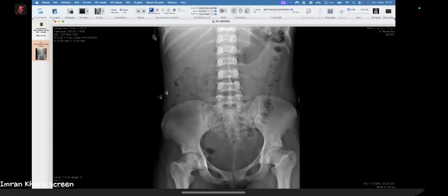And so in this kind of case, you've picked up the most important findings, right? You've picked up that there's H-shaped vertebrae, there's avascular necrosis. You've added 1 and 1 plus 2 together to give the diagnosis of sickle cell disease. You can give the relevant negatives in this case. What would be the relevant negatives, bearing in mind this patient has got an abdominal X-ray? So we've done it obviously for abdominal. I could not appreciate splenomegaly, so I would check if there is any history of splenectomy, or it can be autosplenectomy as well. Or there is definitely no AVN, definitive AVN on the left side.